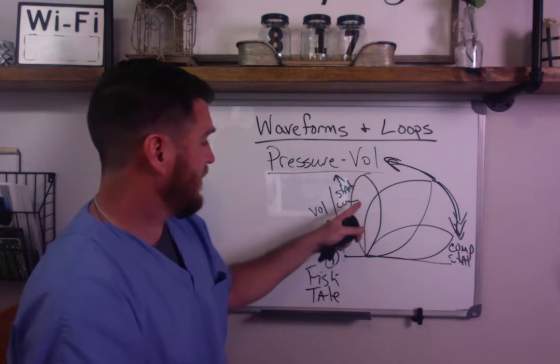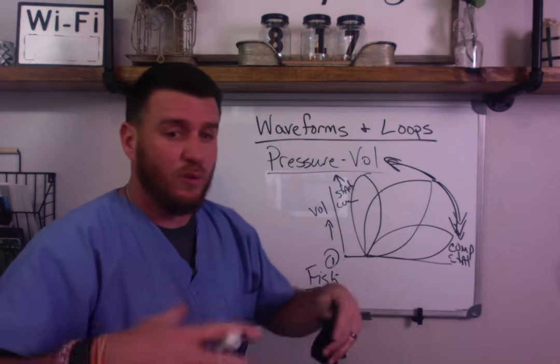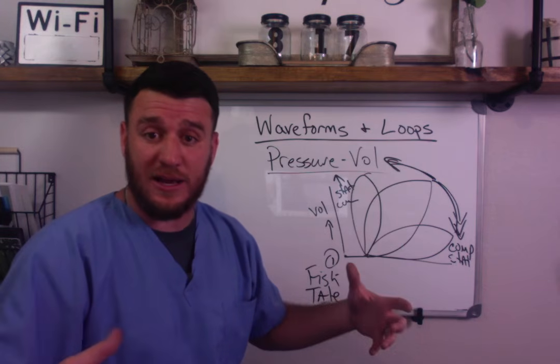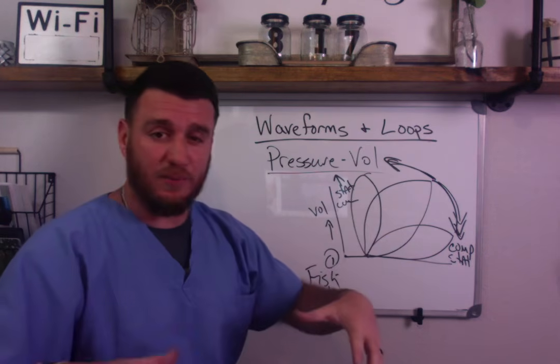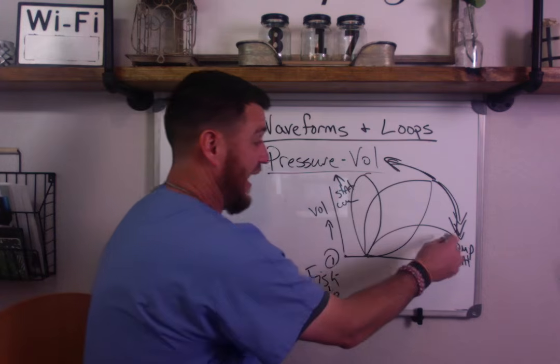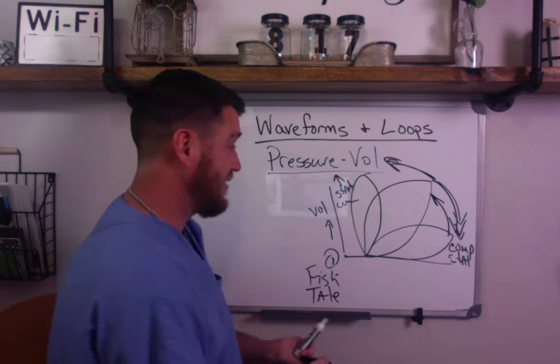Well, this would look more like an emphysematic patient. Their lungs are big and floppy and have very little resistance to volume because of the destruction of the distal airways and alveoli. So they have an increase in compliance, which allows them to stand up. The more common approach to this is understanding that when a patient comes in looking like this, as they get better, they will move up to this, and that's a sign of an increasing compliance, and that's a good thing, okay?